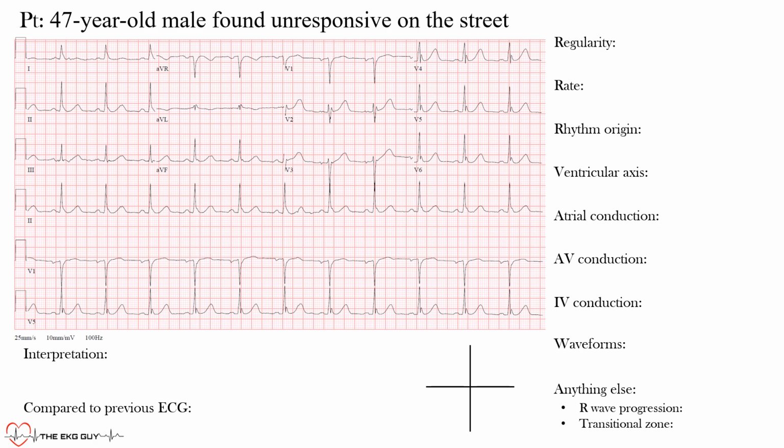Here we're going to get back to our EKG of the week, okay? In this EKG of the week, we have a patient that's presenting, a 47-year-old male found unresponsive on the street, and you have this EKG when you first see him, okay?